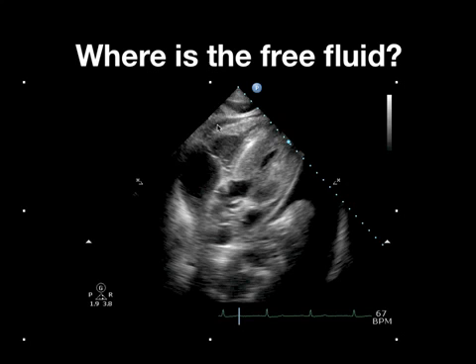So this is a pericardial effusion, but you can also see that there's some anechoic spacing right here, and this would be on the caudal side of the diaphragm. So this is a patient that also has free intra-abdominal fluid. In the medical patient, this could be ascites. In the trauma patient, obviously hemoperitoneum. But you can also see that there's a large anechoic space here along the left side of the heart, but this doesn't fit the shape of the container of the pericardial sac.